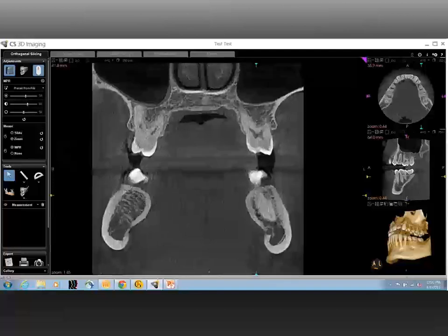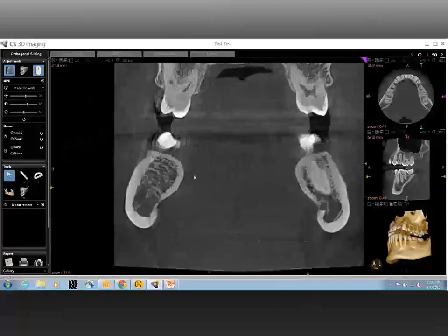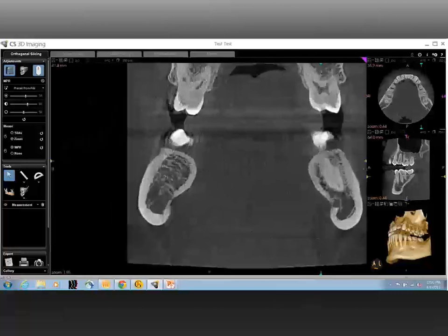Since the traditional way of examining bone density cannot be applied to CBCT, it is imperative to go through all these three different types of, for lack of better words, types of bone or different parts of bone, to understand a certain pattern in which the bone could look different from one side to another or between two different individuals.